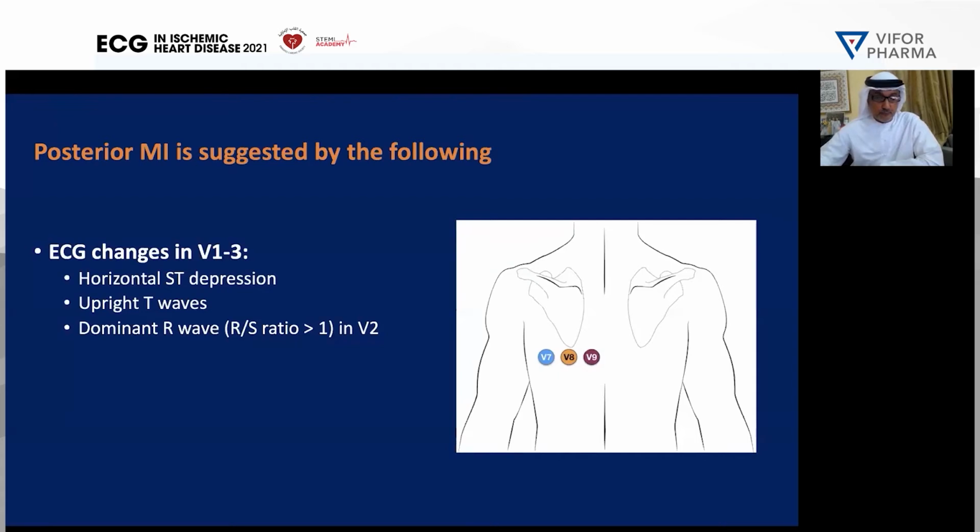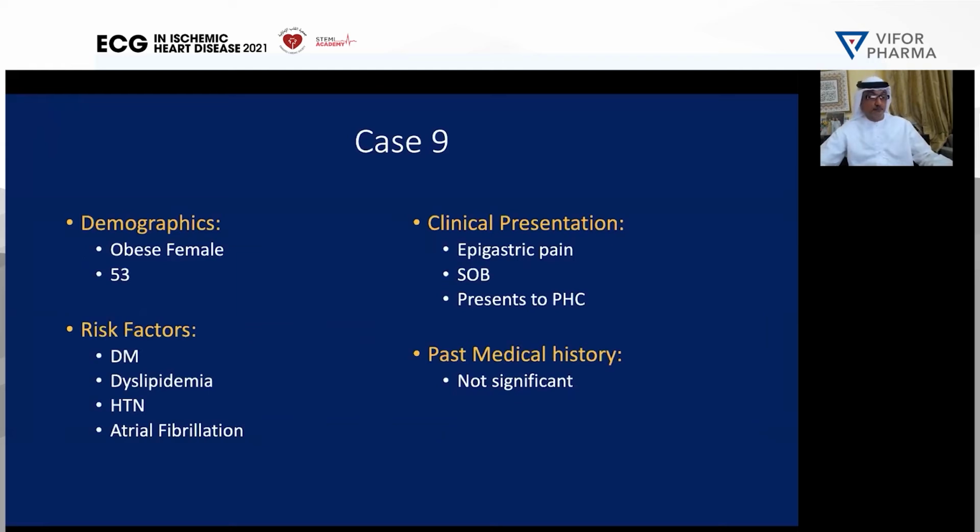Dr. Sharif, any comments? Yeah, it is what you said. This is very important, that we have to understand and respect the reciprocal changes, the V1, V2, and V3 ST segment depression. This is very important. Excellent. Okay. Yes. Now let's move to the next case, case 9.